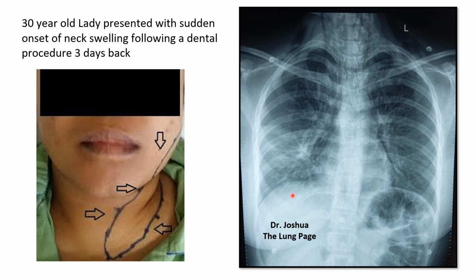So we all know how to read the chest x-ray with the ABCD order. We see airway okay, bones everything is normal. Cardiac contour is normal, but you can see here a little bit of lucency, and diaphragm normal and lung field everything's normal. Here is a little bit of white patch.